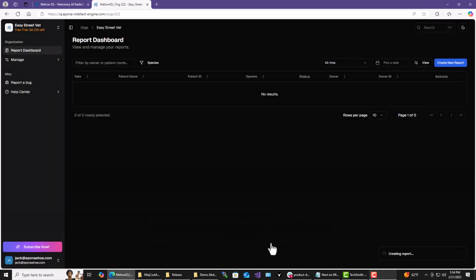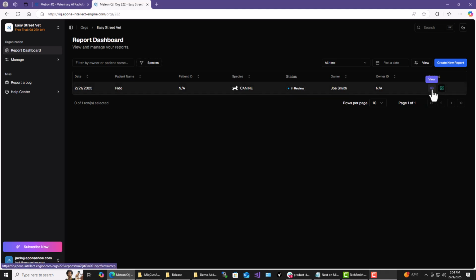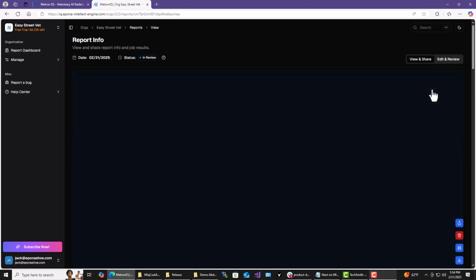So we'll do that and click upload, and now you'll see down here, report successfully created. View it under view reports. So here's our first report in our system for Fido, canine, owner's Joe Smith. We could have put in a patient ID, an owner ID, etc. if we wanted to. And now we can click here on the View button to view the report.